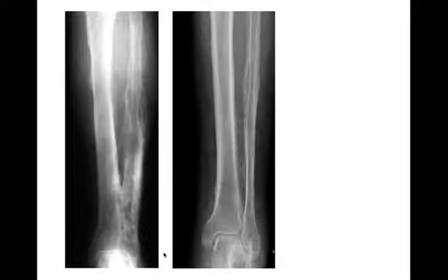There's another case, a radiograph of the lower extremity. This looks really bizarre. I'm not sure this periosteal reaction fits into any of the neatly classifiable ones. Clearly there's some periosteal reaction here. It's wispy and quite prolific along both the tibia and the fibula, and there's some solid thickening here, and this wispy periosteal bone around it. Very bizarre looking. This is just a strange case of periosteal reaction from venous stasis. Not the most common appearance, but long-standing venous stasis is a common cause of periosteal reaction. You see that in the lower extremities a lot.